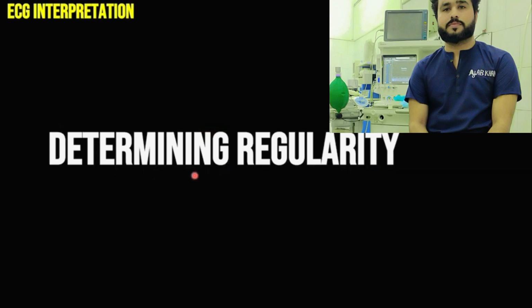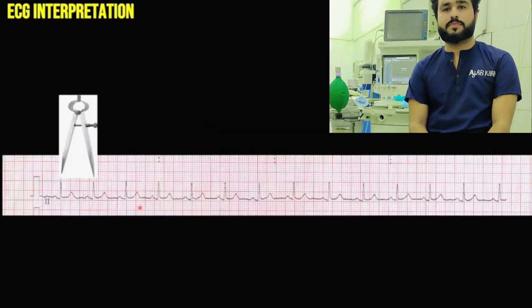Now, how to determine regularity in an ECG? Regularity is basically the distance between the QRS complexes. If the distance between the QRS complexes is constant, that is a regular ECG, which is normal. If the distance between the QRS complexes is changing, whether it is increasing or decreasing, that is an irregular ECG and that shows abnormality. You can use calipers or simply use a ruler. You measure the distance between two QRS complexes and keep measuring it ahead. If the distance remains the same, it means that it is a regular ECG.